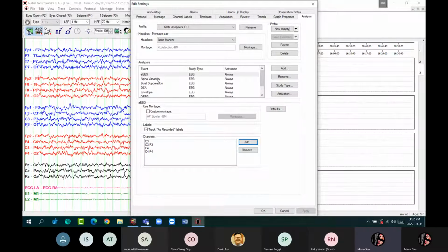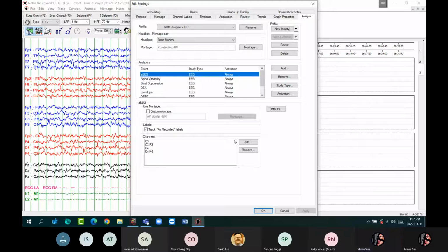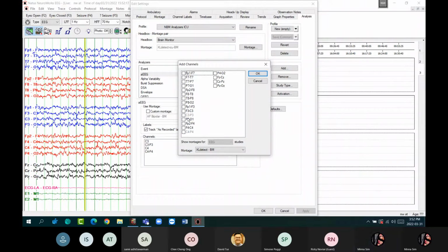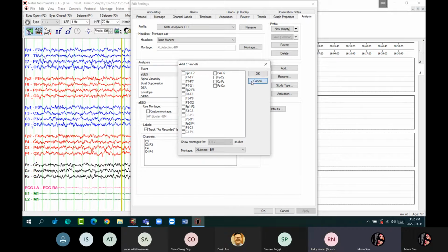So over here, the default setting is actually showing these channels, which is not enough. So I would suggest adding more channels. Is it okay? Okay, thank you, Mia. Yeah.